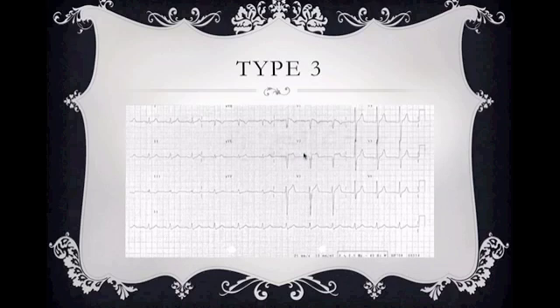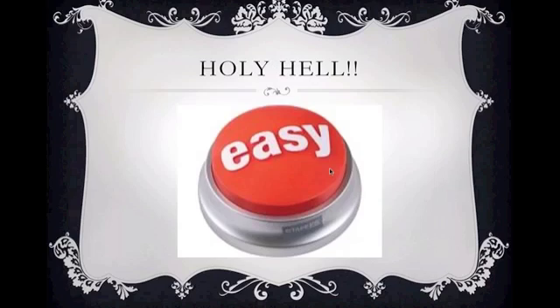All right? Again, a mixture thereof. We have ST segment elevation followed by negative T here in V1 plus a saddleback ST segment there. All right, so this is a combination thereof. Type 3, very hard to pick out in the field. With practice, we could do it.